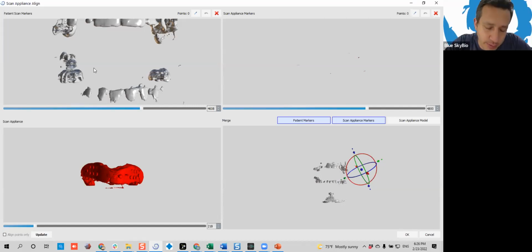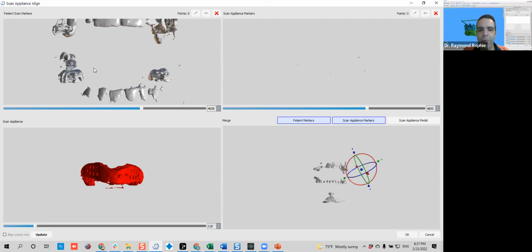And in the software, maybe we'll see a little later on the select scan body screen, we have a button there that says use abutment as scan body. You can just click that button and then select the relevant abutment to use as your scan body. And the great thing is that we're implementing some very cool features where you will be able not only to align the abutments, but also to make analog models as well. So really nice things are coming.